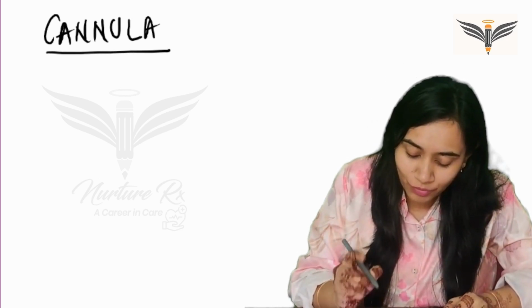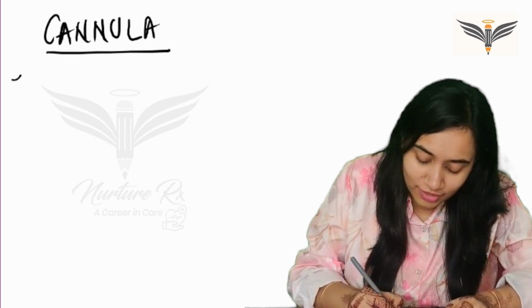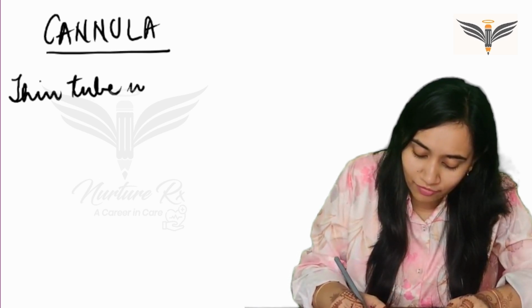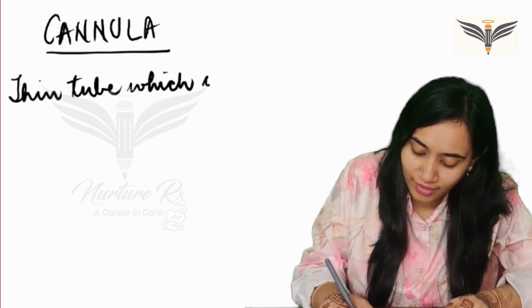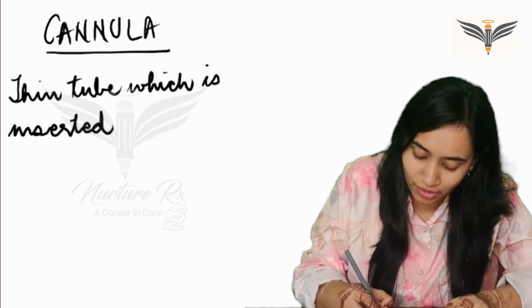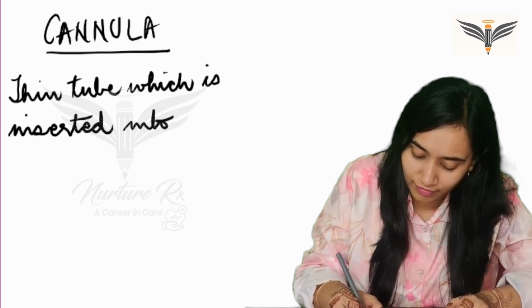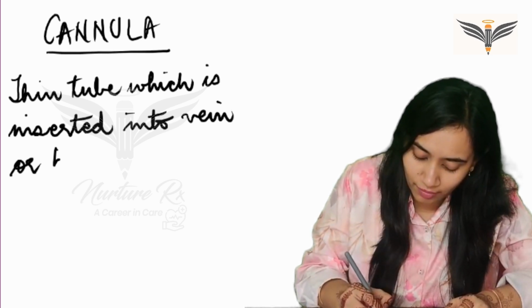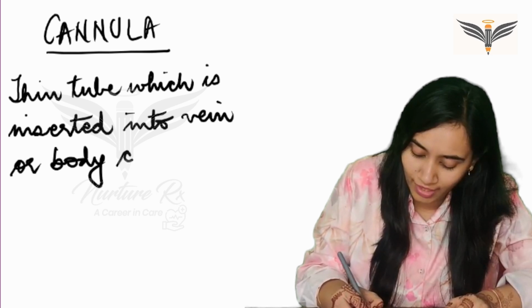So firstly, what is a cannula? It is a thin tube which is inserted into your vein or body cavity. And what does it do?